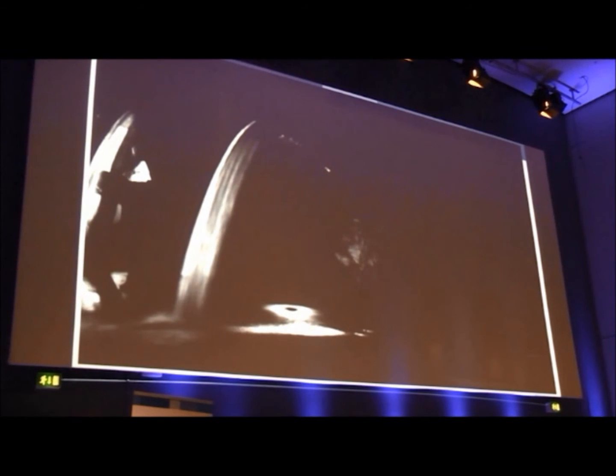And this is exactly what you might be able to see if you have a fibrosis on the RPE or any kind of highly reflective surface on the RPE, and you see vessels in it. You need to first check, are there vessels above it that have exactly the same look? Because this is how they're caused. So you need to be aware of this artifact and understand where it comes from in order to be able to correctly interpret OCT-A.